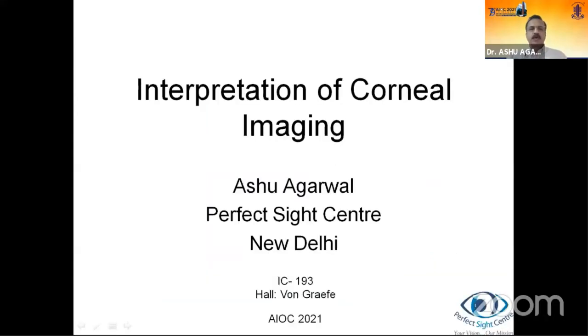Fine, thanks. So I'll be talking about interpretation of corneal imaging for a refractive patient. And the objective, of course, is to ensure that we do not end up with certain unfortunate incidents like ectasia.